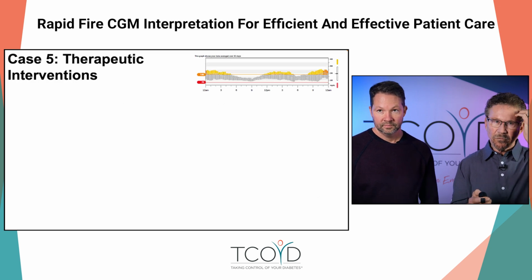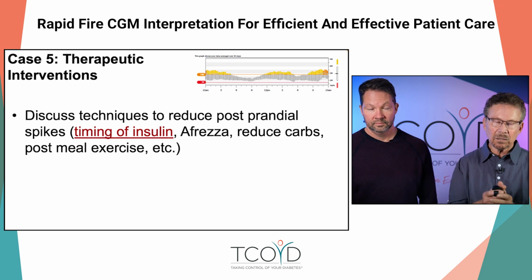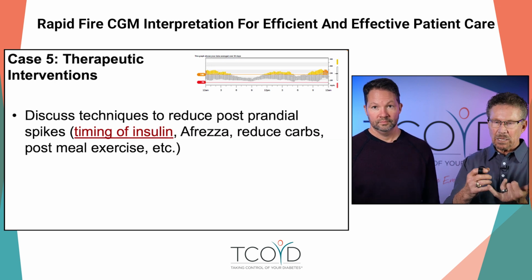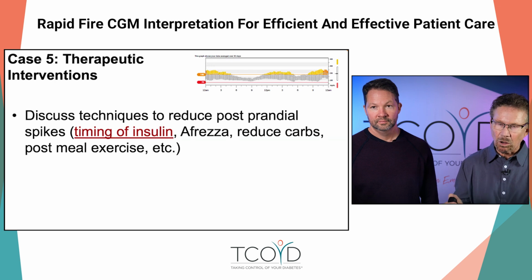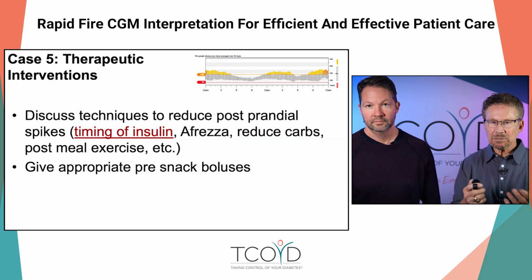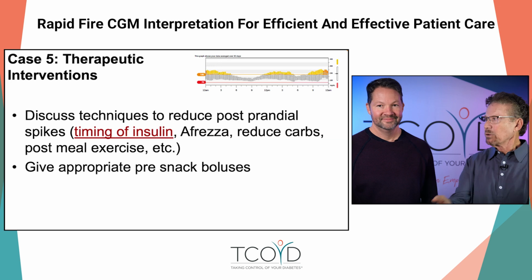So there's her profile on the upper right. And these are some of the things that I did. I discussed techniques to reduce postprandial highs, without getting into a whole hour seminar. Timing of insulin, Afrezza, reducing the carbs, and some post-meal exercise can all help. Whatever she can do. Give appropriate pre-meal snacks. Give appropriate pre-snack bolus. Bolus for snacks.